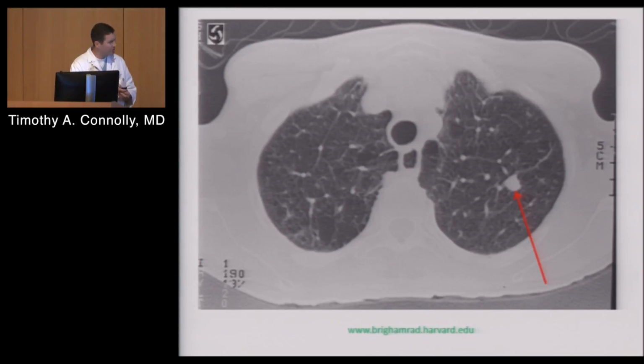So there's a nodule, and the reality is that's just sitting in the middle of nowhere. These are the ones that are really hard because thankfully this one's big enough. You could probably do a PET scan and see if you need to chase after it right now, or you could wait and watch. It's not one that's easily going to be obtained by bronch, and it's not easily going to be obtained by CT-guided biopsy from the outside.